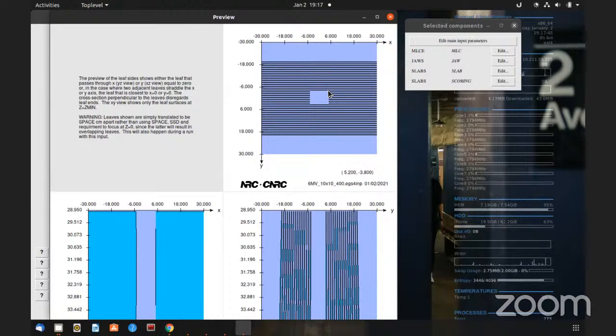No, sir. See the x-axis. It is also 30. That means the leaf opening side is 30, sir. I don't get it. I don't understand this. You can change the value there. Okay, because this is the leaf, right? This is the leaf. Yes, sir. Agree? Okay. So we're saying what's minimum and maximum? To me, it looks like okay.